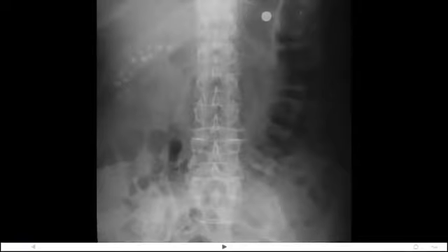In this second film, another clear pathology can be seen. In the right upper quadrant, a number of small white lesions which are likely to be consistent with multiple gallstones. It should be remembered, however, that only 10% of gallstones are radio-opaque, and so an abdominal film is not used diagnostically to look for gallstones, and the only accurate test is an ultrasound scan.